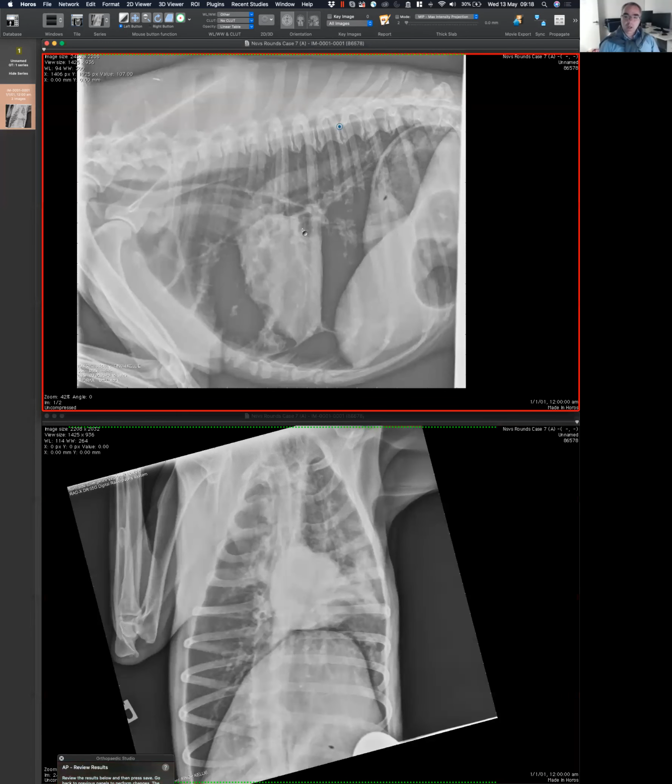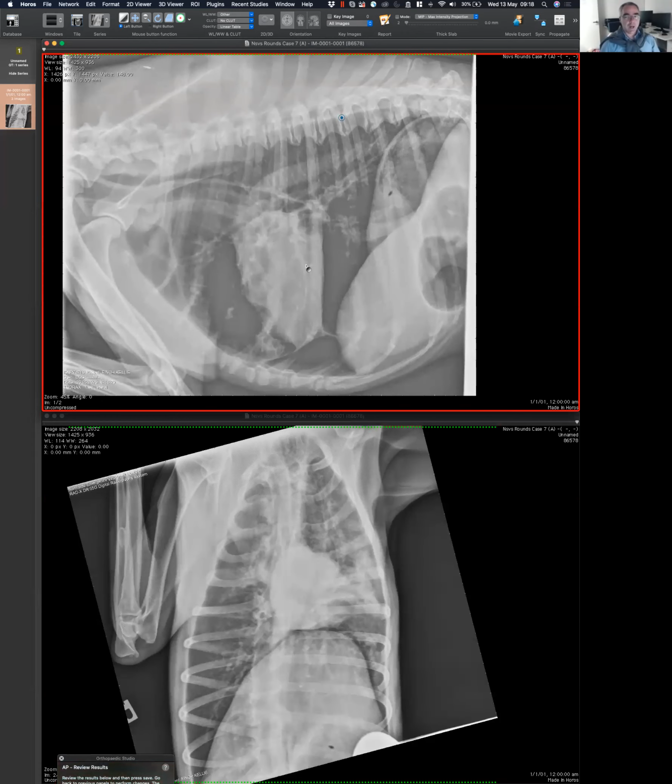When you mention the cardiac vessels, those actually cannot be cardiac by definition. And the reason why they cannot be cardiac is for the same reason of the grape surrounded by water. So the coronary vessels are in contact also within the myocardium. So unless you put contrast, it's grapes surrounded by water. What we are seeing there are pulmonary vessels that again are superimposed. Makes sense? So in the same way that they're superimposed over the liver, now they're superimposed over the cardiac silhouette. So the difference here is, again, you're gonna get sick of me, you're gonna shoot me with grapes. This is the same example of the grapes. This vessel is a grape surrounded by air, and the heart is another grape, and they are not in contact. We see both contours. Is that all right? Yeah. And we will come back to this 100 times.